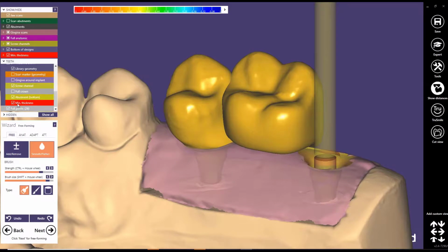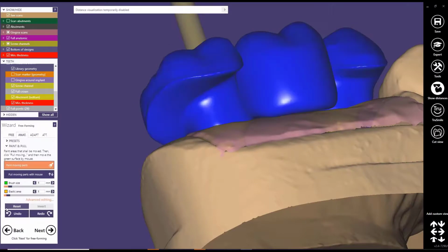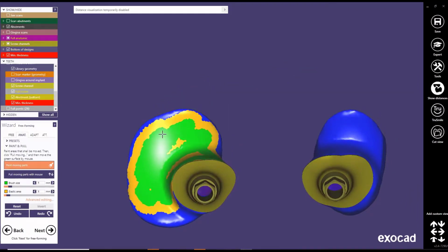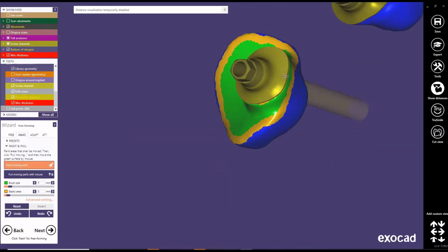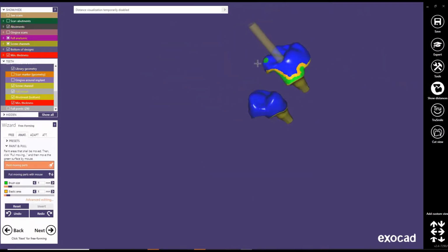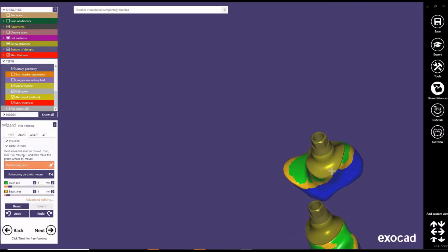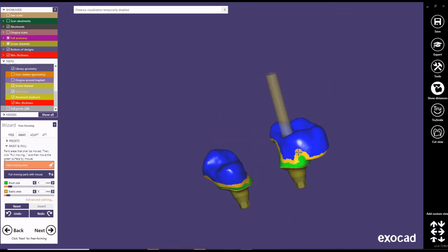Let me enable the visualization of the elements 25 and 27, and here I would share with you another useful tool, especially when you use the mirror like we did before. As you can see, selecting the paint moving parts it is possible to select the parts that we want to modify, and especially in this restoration the part that I'm selecting is the part that we want through the gum.